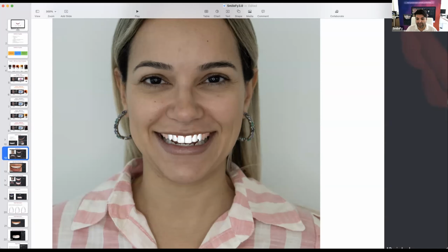These files are STLs or OBJs, and they are specifically created for print, CAD operation, and milling. The 3D design does not look very natural with these kinds of designs. ExoCAD and all other companies use the same files, OBJ or STLs, and when you do the 3D design, it looks like this.